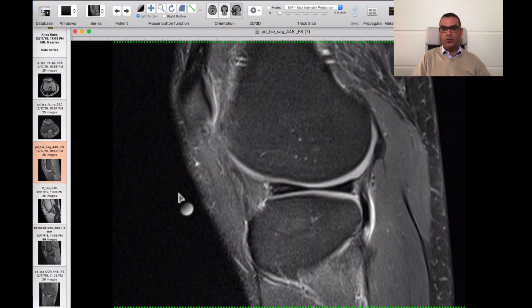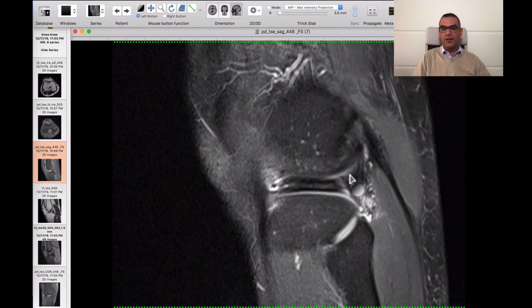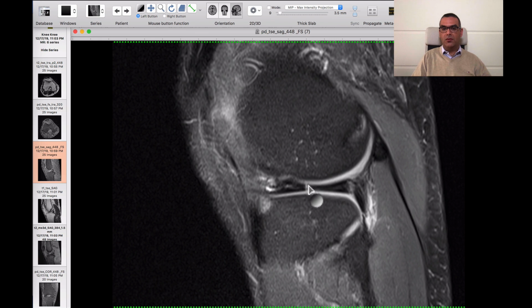And now we go to the lateral meniscus, and you can see there is an interruption at the body. There is a linear vertical signal interrupting the meniscal body from superior to inferior surface, and this happens when the body is rectangular in shape. You should see the body like this, but at the central aspect there's an interrupting signal, so this is a vertical radial tear.